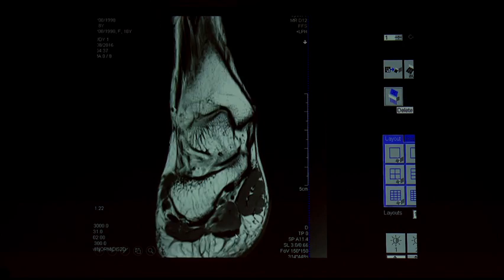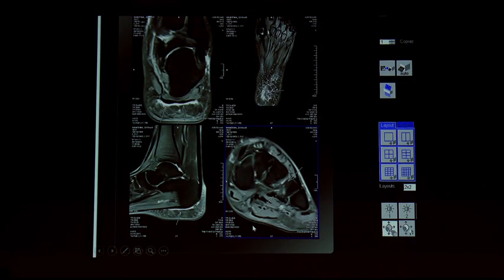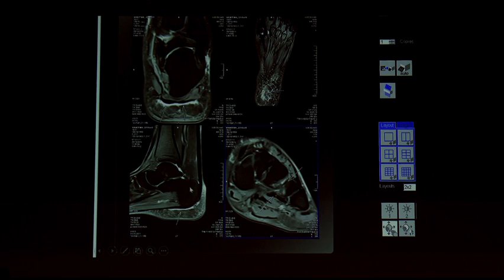When I am coming down more anteriorly, we are able to see the sagittal also nicely. The central band will go and the lateral band will also be seen. In plantar fasciitis, we will have significant inflammatory changes. The fluid collection will be seen over here. You can see the thickness will get increased, and a calcaneal spur can occur and marrow changes can occur.